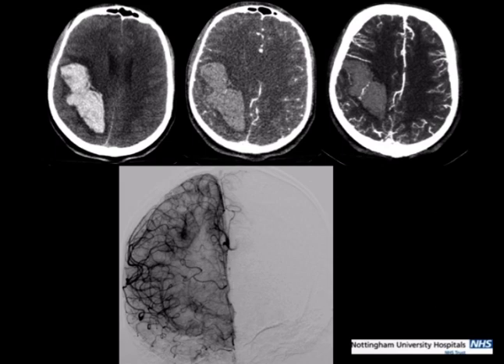I said that we'd talk a bit about investigating spontaneous intracranial hemorrhage, because in children, this isn't going to be due to hypertension, it's going to be due to an underlying cause most of the time. And I just wanted to show you a tip for CT angiography. This is a 14-year-old who fell down some stairs and then became aggressive, dropped his GCS, but before he dropped his GCS was complaining of some left-sided numbness.